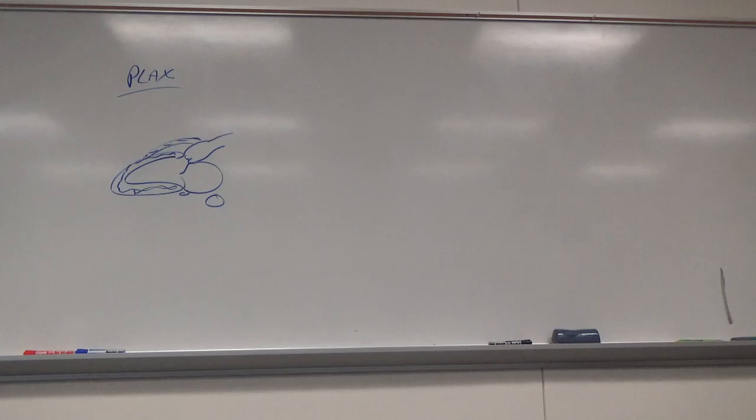Size of chambers? Size of chambers, absolutely. So we're going to have charts that give you actual sizes of chambers, the ranges they should be in. But we also want to compare them relative to each other. So if I've got this LV sitting here and I've got this massive LA, that's an important thing to note. Okay? You're going to notice a relative size of things and catch that with your eye right away. And sometimes it's going to look super big or super small and you're like, oh. And then you put your calipers on and you're like, oh, it's not that bad, because you realize I'm totally zoomed up on it. Or I'm totally zoomed out and it looks small but it's actually big.